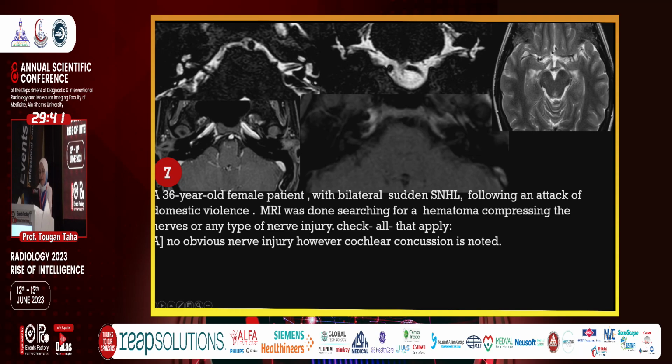My next case, a 36-year-old female patient with bilateral sudden sensory neural hearing loss following an attack of domestic violence. MRI was done searching for a hematoma compressing the nerve or any type of nerve injury. Please check all that apply.